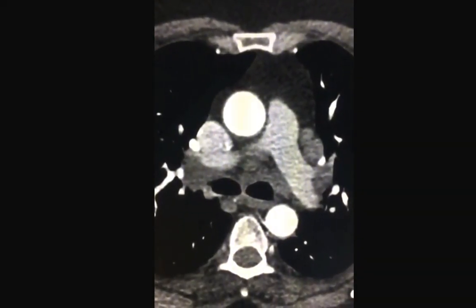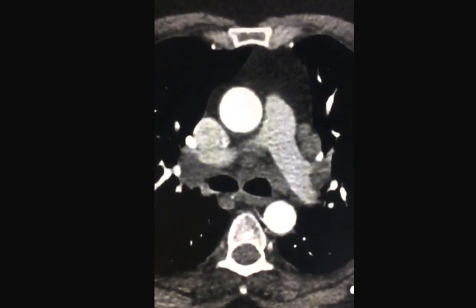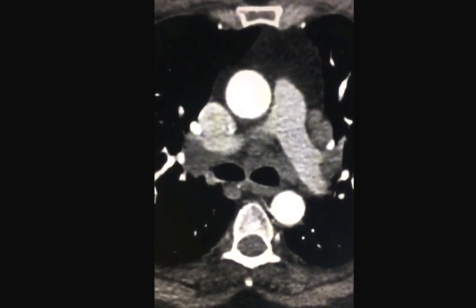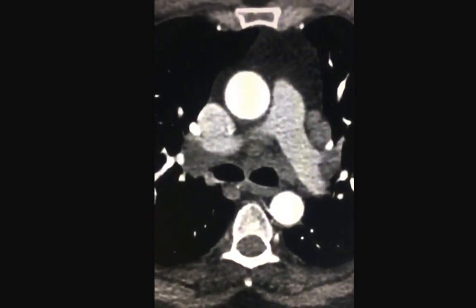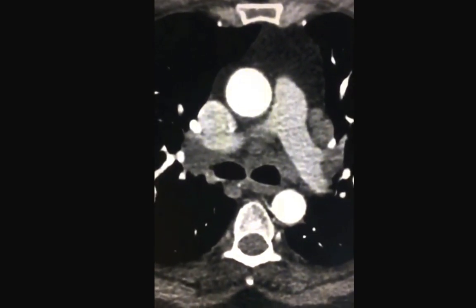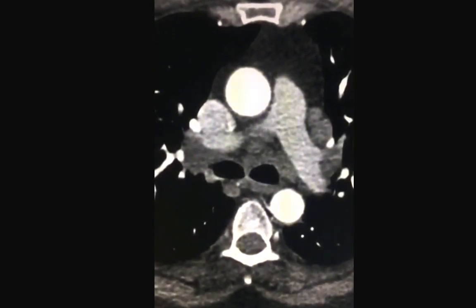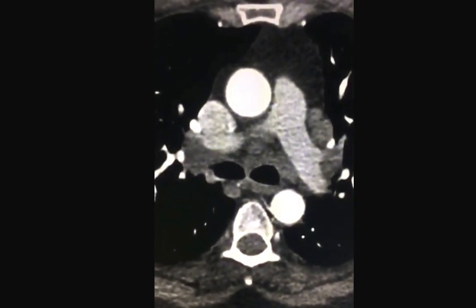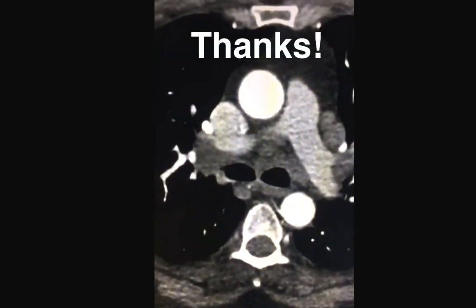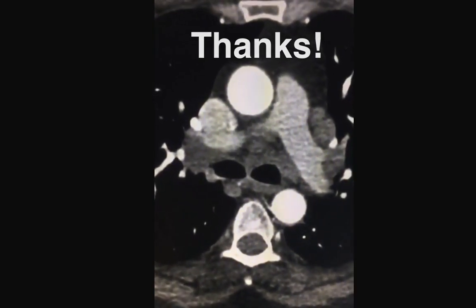Common categories for lymphadenopathy of the mediastinum would be metastasis, lymphoma, infection, and sarcoidosis. When lymph nodes are large, in the cases of infections such as tuberculosis or metastasis, you'd expect to see some necrosis. The classic entity to give you bilateral symmetric hilar lymphadenopathy is sarcoidosis. Although the others are not excluded, you'd know based on the history. That's it for this case. Now let's go to the second case of the day.